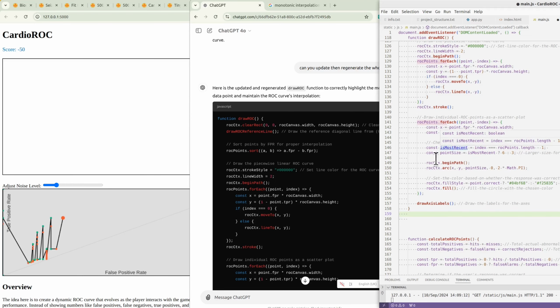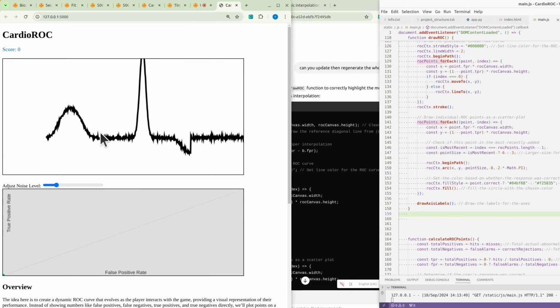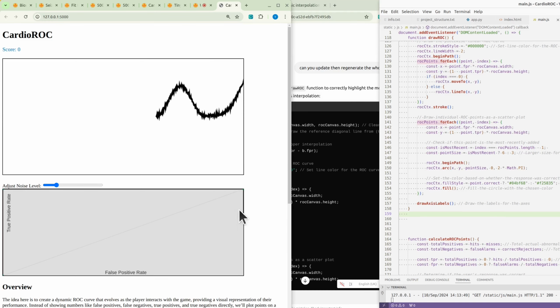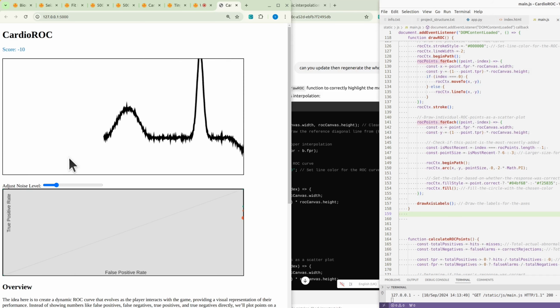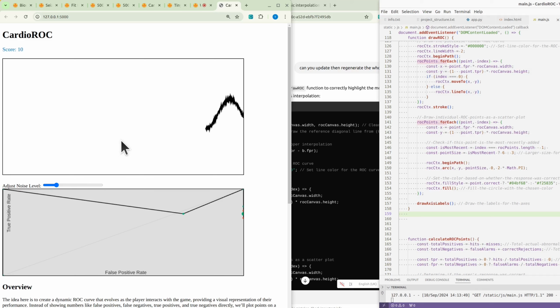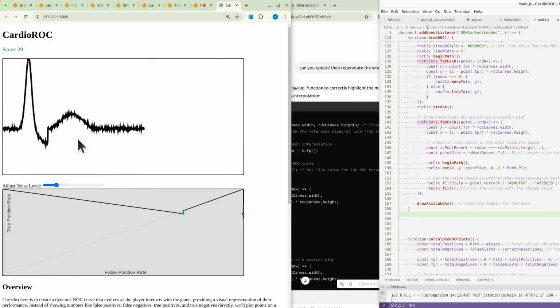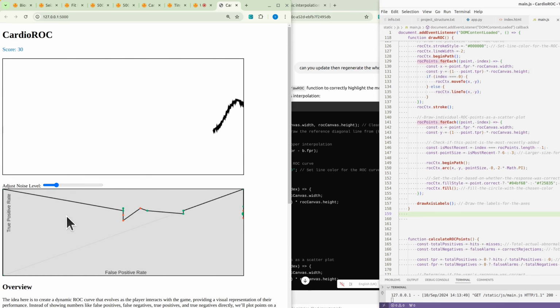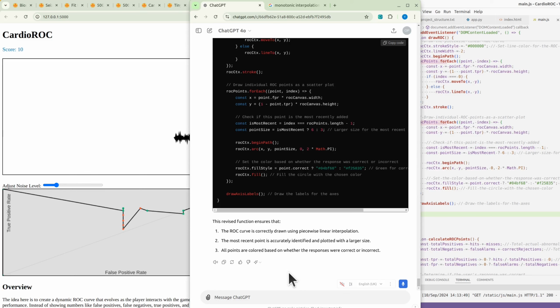Testing it will be a pain, wouldn't it? So if we missed this, we should have a red somewhere. That's right. Click on it, should have green. Click on it, should be red. Green, that's correct. Red is correct. Now this one. Shouldn't have clicked on it. We don't click on it. Right. That new point should have been... So good results are getting towards the top left corner, bad results are going towards the bottom right. So that's pretty much all you need to know about the ROC curve.